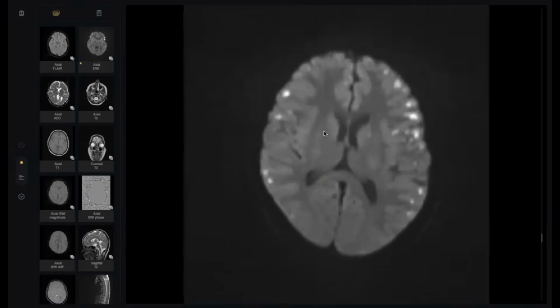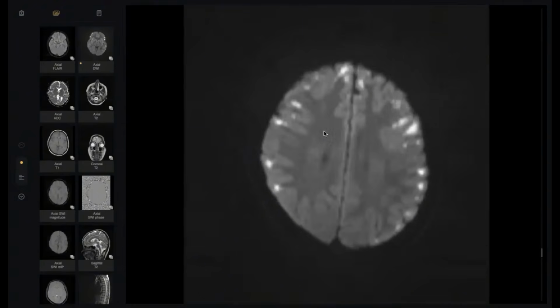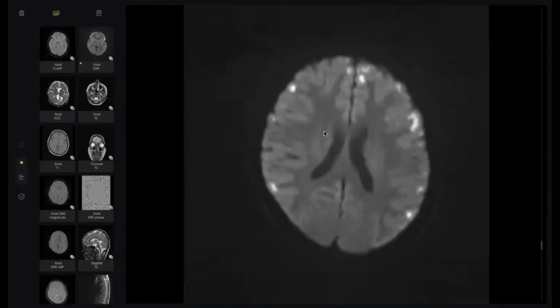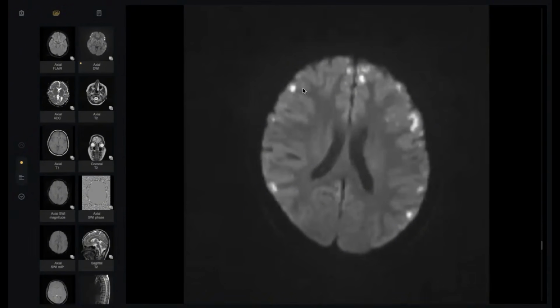Not typical. Showering is more extensively random. This patient has fever, cysticercosis maybe? No, see, now we excluded infectious nature. And you suggest infarction.